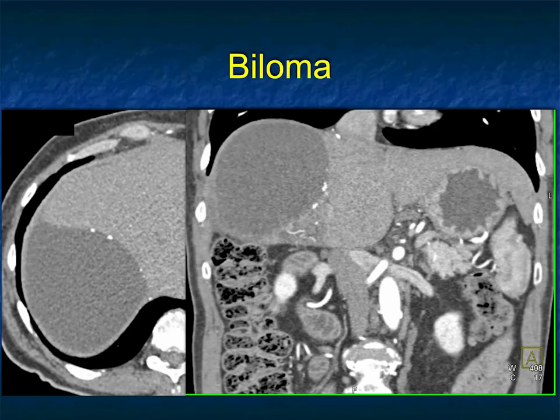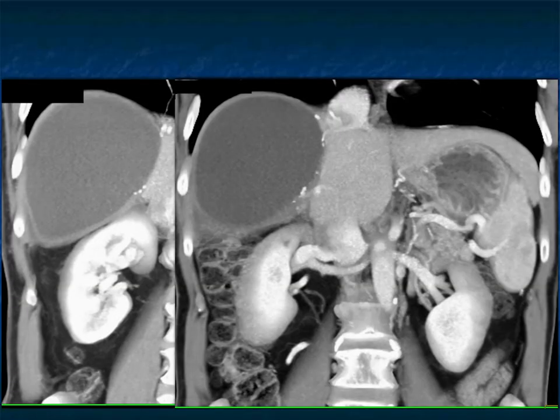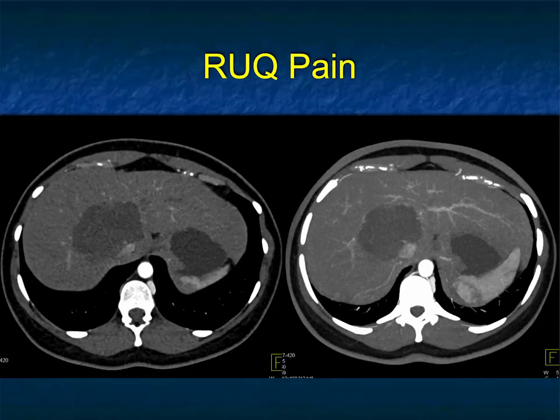You also can have hematomas, and when they're more chronic, they're typically water density, hard to distinguish from biliomas, but again, well-defined, sharply marginated. The one thing you would say about this case is it's a benign lesion, noticing the clips present and then looking at the patient's history. Again, history can be helpful. This is simply going to be a bilioma, which typically will resolve over time, or you'll simply leave it alone, or if the patient is symptomatic, you would actually drain it.